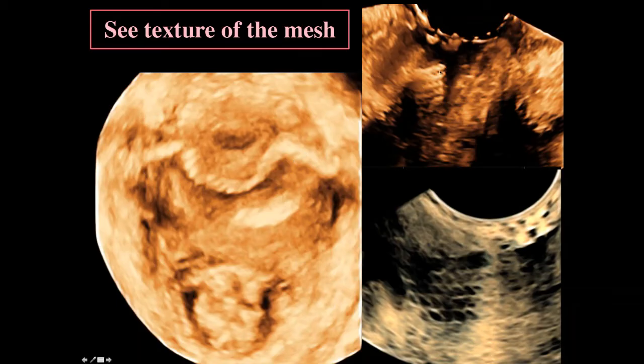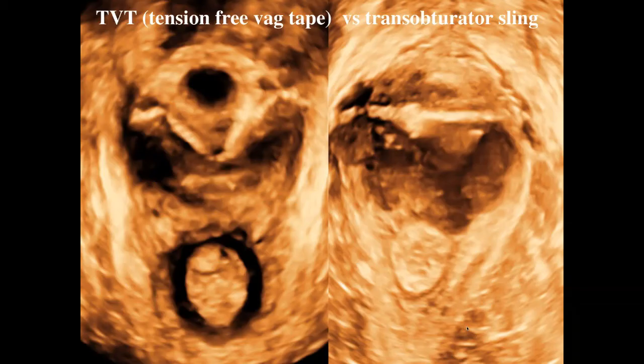And if you look at the texture, now here we're a little bit tangential to the mesh here, and I'm just attempting to show what the texture of this mesh is that they put in there. So it's like a tape. In fact, it is a tape that has some width to it. So there are two tapes that are slings that are currently in use. You can see them both here. They're pretty obvious, so you can tell which one you have when you're looking at it.